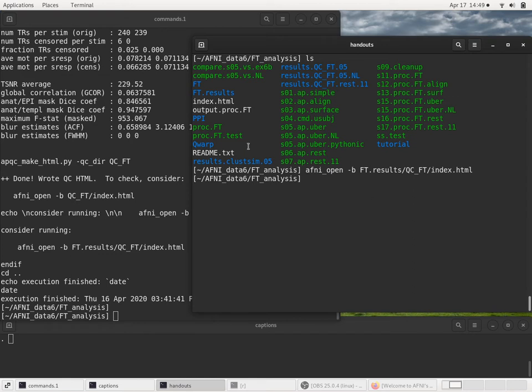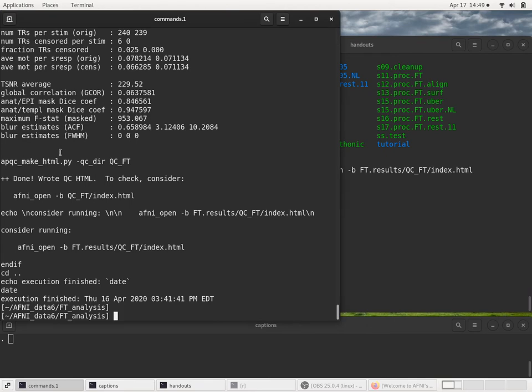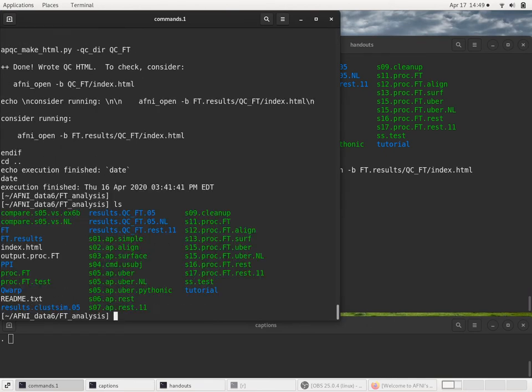So now that we've generated the ft.results directory, let's look in there, and we'll have two terminal windows running, one to run commands in and one to probably look at the script. So I think I'll leave my right terminal to look at the script since it's on the right side. New windows are less apt to appear there. Of course, that puts the text in the middle instead of the text on the left, but we'll try it out. And in this directory, I'll run some commands.